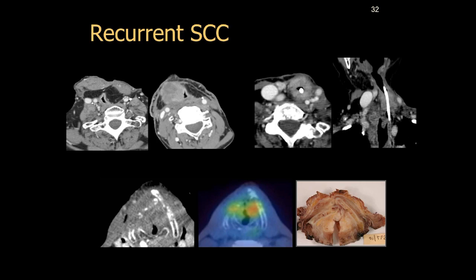And this is a patient who had a more diffuse, dispersed recurrence in the context of previous radiotherapy, and these scans can be quite difficult to interpret. Therefore, PET-CT is sometimes done to differentiate these post-treatment changes from tumor. The recurrence was subsequently confirmed on pathology.